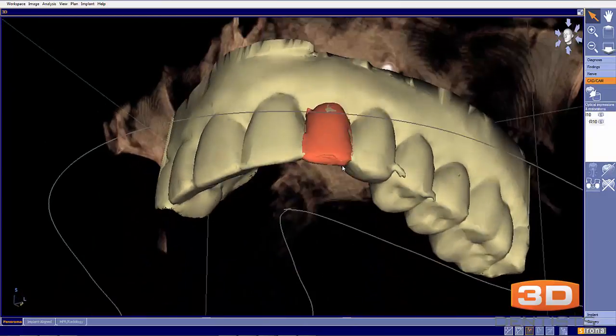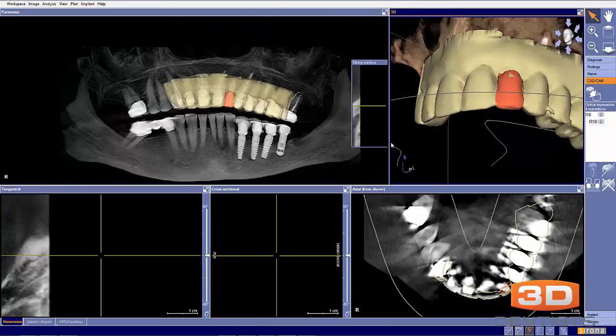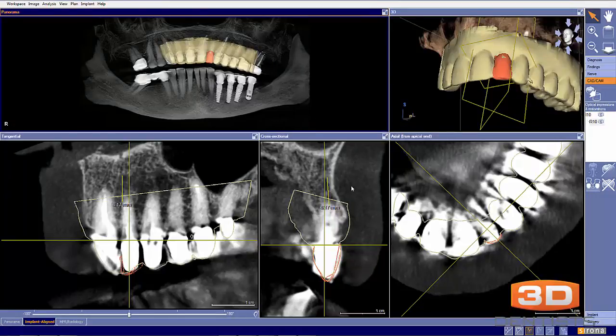I hope that makes sense in what I'm saying there, okay? So from that perspective, those are the things that we look at there. And now we're ready to go ahead and take a closer look at the surgical site.